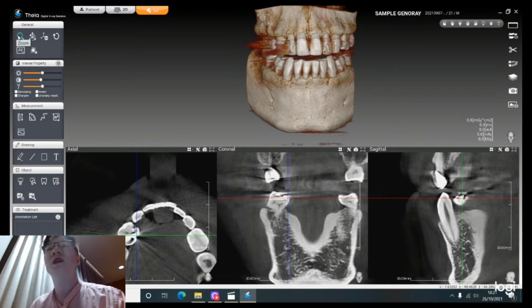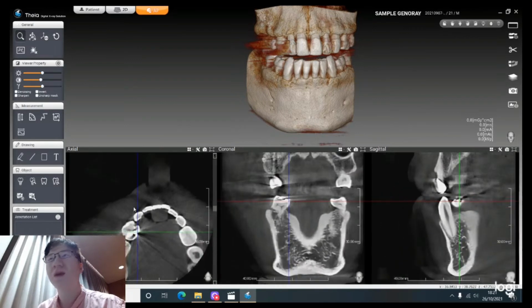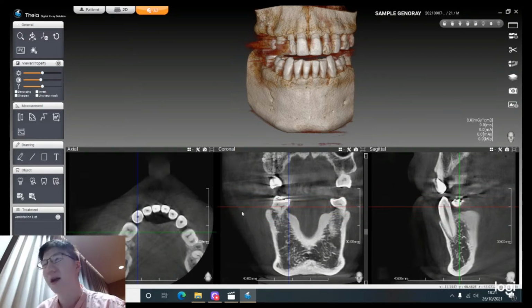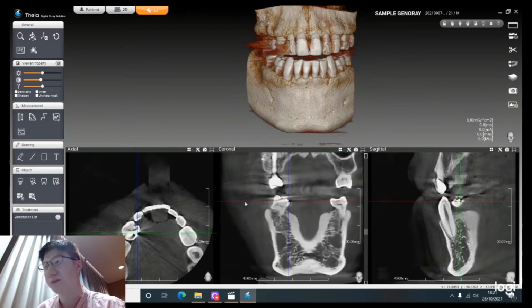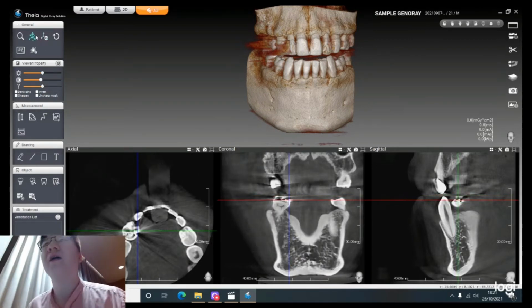So this thing that looks like a magnifying glass is for zooming. So if I press the zoom button and it has become black, you can see that now when I scroll my mouse up and down, it's actually zooming. Yeah, if I didn't do that, it would just change the position of the red line, and I'll talk more about that later. Yeah. Okay. Next we have crosshair centric.